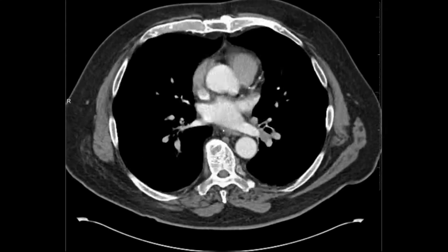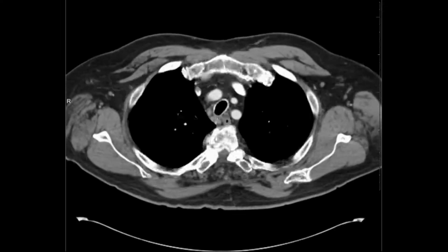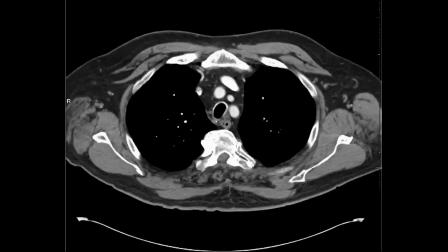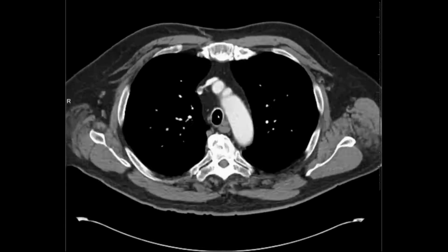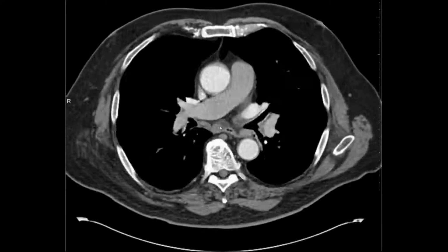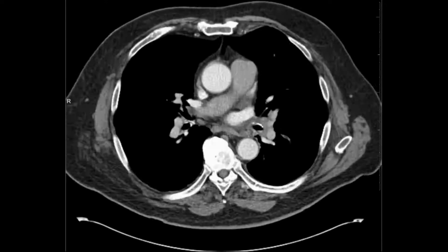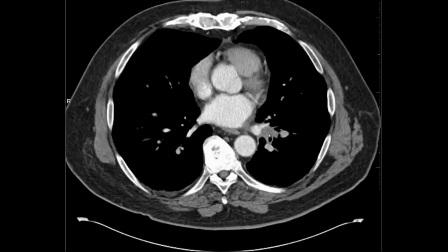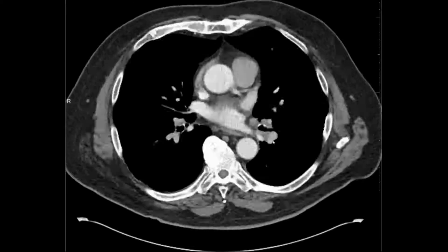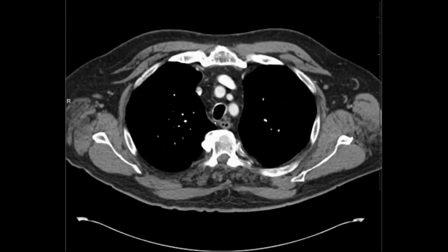So next I want to evaluate for lymphadenopathy. And as you can tell, immediately you can see that there are just abnormal lymph nodes on the contralateral side of the upper trachea here. As well as the subcarinal location is just kind of a conglomerate of abnormal appearing lymph nodes here. If I look more closely in the hilum, which you kind of have to do every once in a while, you'd see this abnormal appearing perihilar node. And so based on this, we have contralateral nodal disease here.